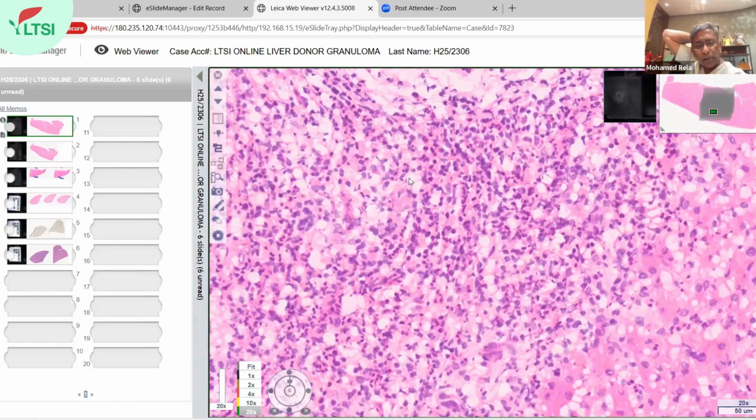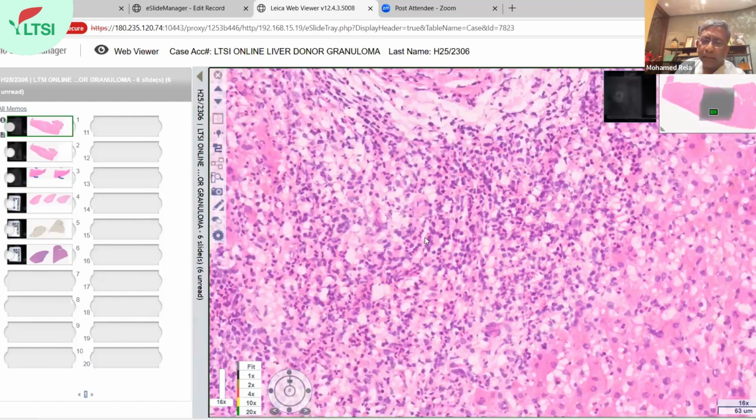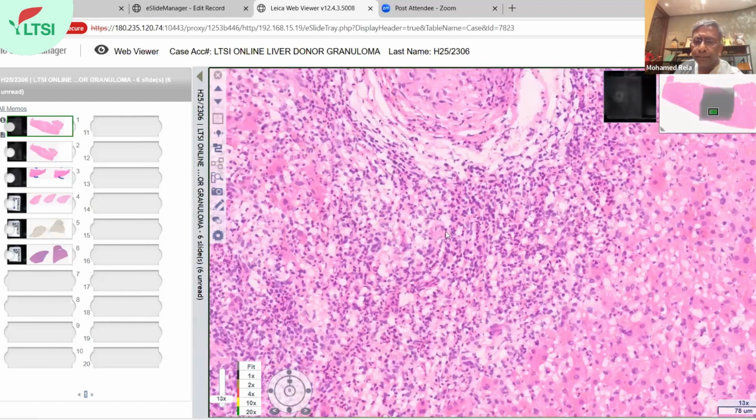So clearly here, an eosinophilic granuloma from a person from Yemen, you have to think of parasitic infection. This patient should be treated, and then after treatment, in about two to three weeks, should be fit to donate once again. This was last week, so we have not transplanted this patient yet. Okay. Thank you.